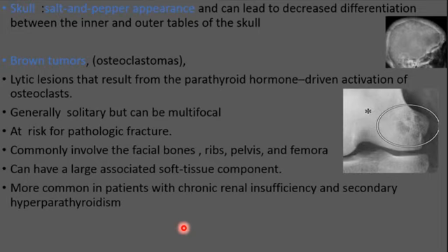This brown tumor, I think it's not a tumor. It's not a tumor process. It's due to the activation of osteoclasts, which resorb the bone. The body will react with fibrous tissue, blood and hemorrhage, and it looks brown, that's why they call it brown. And it looks like a mass, so they call it a brown tumor. But it's not a tumor, it's just normal tissue.